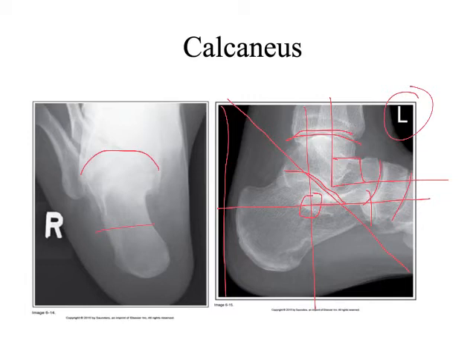If they're trying to place a screw or something in here, they want to make sure it's aligned. They may need angulation there too. All right. Bear in mind, right, that if you're trying to get this image, due to the divergent property of the X-ray, you want to be centered more or less on the anatomy of interest, right? Because if you are not centered appropriately, the anatomy will not be demonstrated. So if I'm looking at this picture and I'm trying to determine, was this a good picture, or do we need to repeat it? Centering is a big factor anytime that we're angling, right?